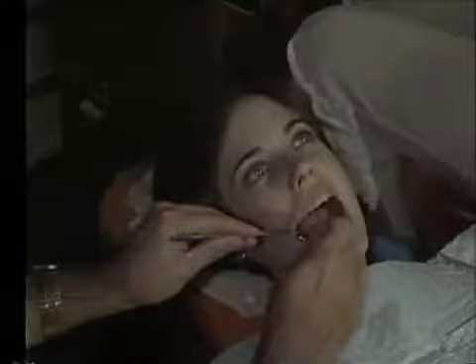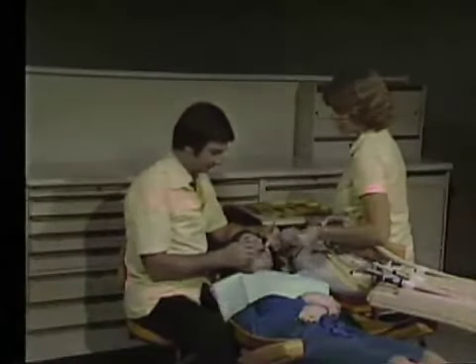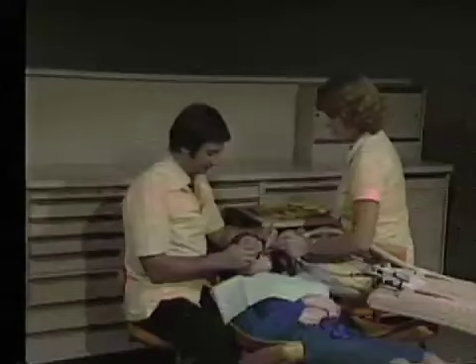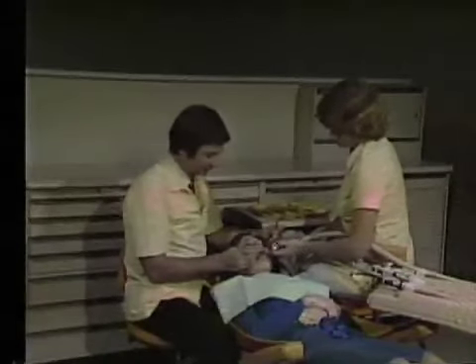The transfer zone is the area used to exchange all instruments and materials between the operator and the dental assistant. This also seems to be an ideal location for the dental unit, since all instruments are within easy reach of both members of the operating team.